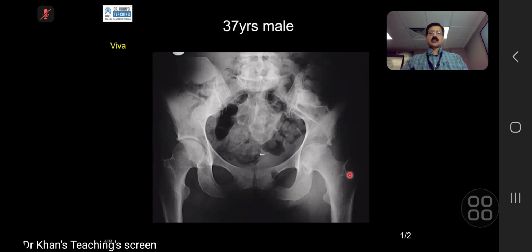Here, distension of the fat planes will be difficult to see in adults. But what is happening is that there is soft tissue obliteration of the fat plane, and there is increased density, which is, here there is fat, and here there is a bit of soft tissue. The key finding is that the joint space is reduced. And then look carefully. The key finding is the acetabulum.